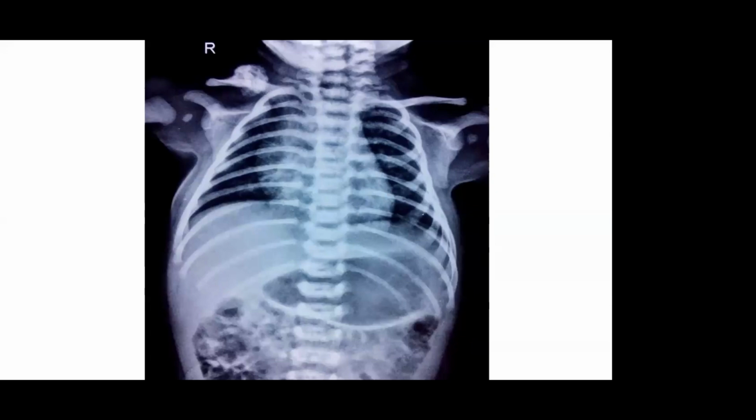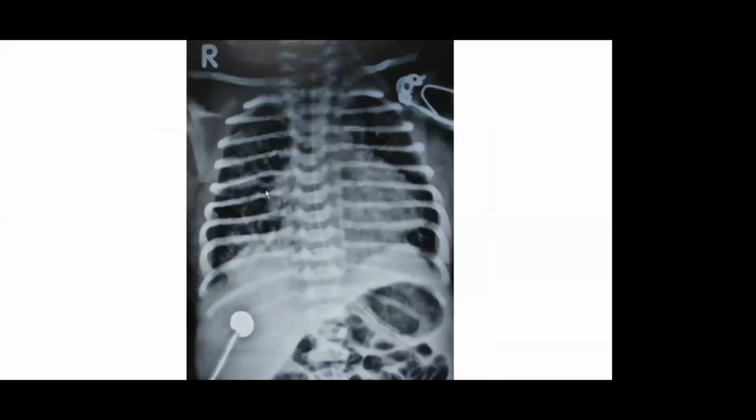I'm not giving you any time to read the X-rays completely, but I'm just trying to make you identify that yes, you should also see the peripheral areas. Overall, yes. Look, again, always try to put findings in when you are reading an X-ray, as findings, not as a clinical or pathological diagnosis.